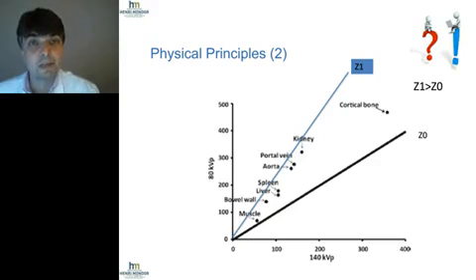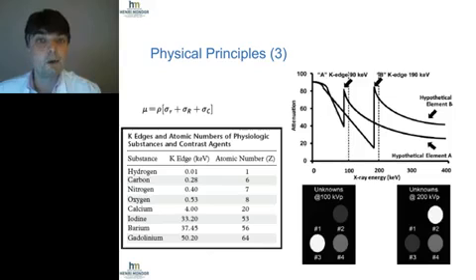And that's the second important point of using spectral imaging: you can decompose materials for which you know the exact attenuation profile. For instance, look at that slide.